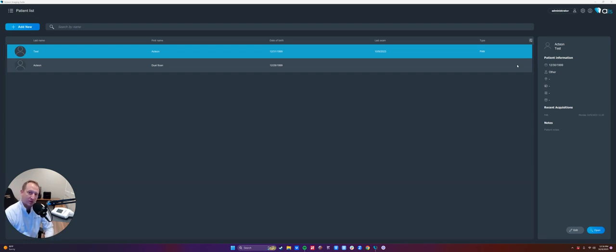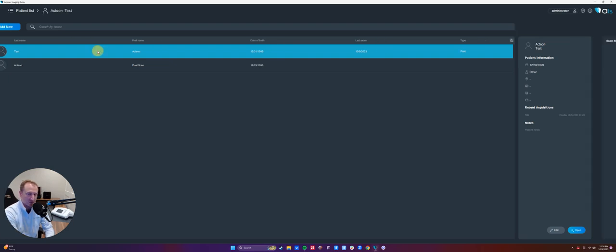I have two patients currently in my database, a test patient and a dual scan patient. If you want to add a new patient, clicking Add New will allow you to input new patient information. Otherwise, we can search by name on the top if we're looking through a long list of patients and looking for one specific one. But let's go ahead and dive into our test patient here by double clicking.